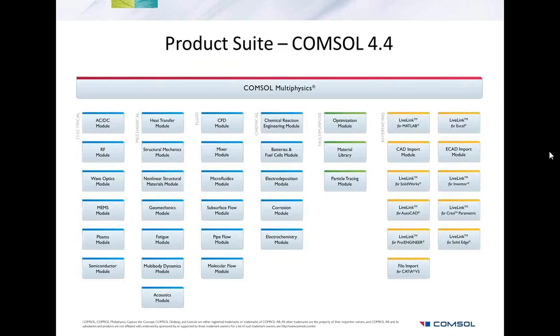It's very easy to do with a function. You simply implement a function inside COMSOL, and you say that the first 3 columns of that function represent your X, Y, and Z coordinates, and your 4th column is your grayscale value. And then we called in that function and converted those grayscale values to density and Young's modulus values with a functional relationship defined by literature.